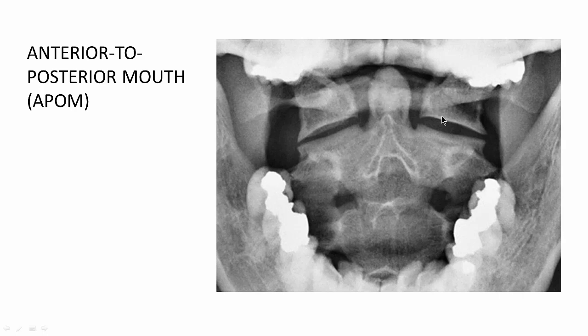Now, I won't get into all the spaces. There are some spaces and measures you learn, but this space between here and here is important. These should be pretty much the same. If the patient was in a car accident, you wouldn't want to see a big space here. Also, the superior and inferior articular processes should be lining up. They shouldn't be overhanging. You can get a Jefferson or burst fracture where this will be way over here.